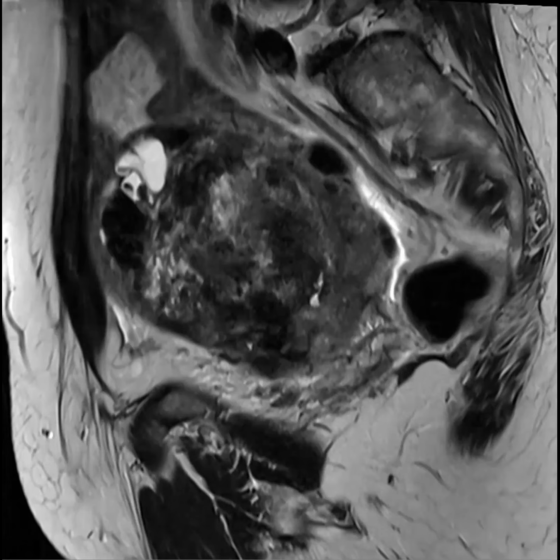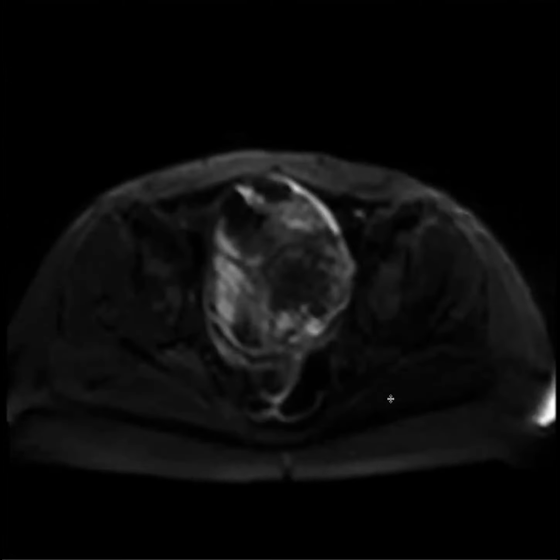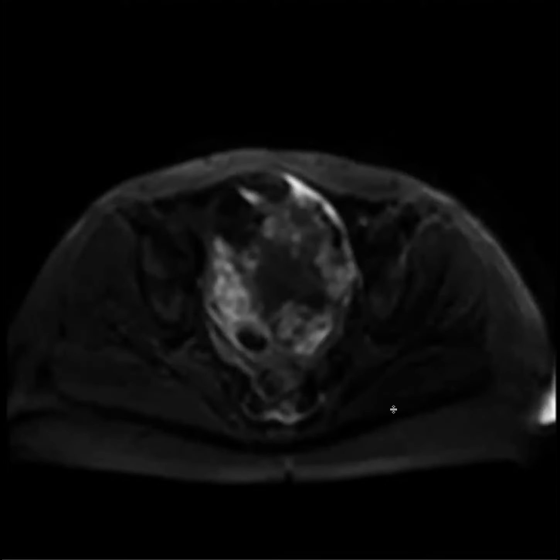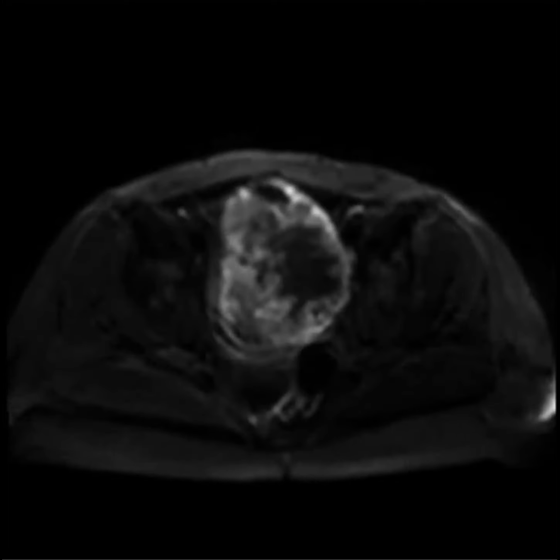And the T2 looks ugly, as has already been stated. And then the diffusion is also abnormal, high signal. It's hard for me to even trace the endometrium. Maybe it's back here, but higher than the endometrium. And then the ADC is also abnormal.